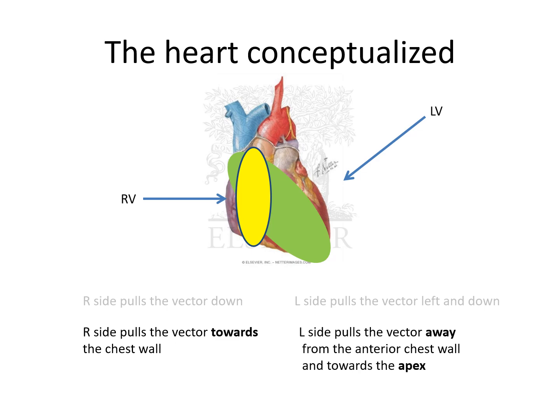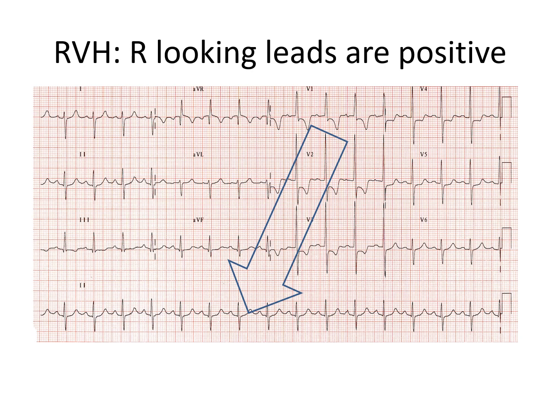down. Then in the 3D, in the precordial leads, remember again that the RV sits in front of the LV and kind of bulges towards the sternum, towards the chest wall. So we would expect leads V1 and V2, which look towards the front of the chest wall, to be strongly positive. Let's first look at a case of right ventricular hypertrophy because it's easier to explain.